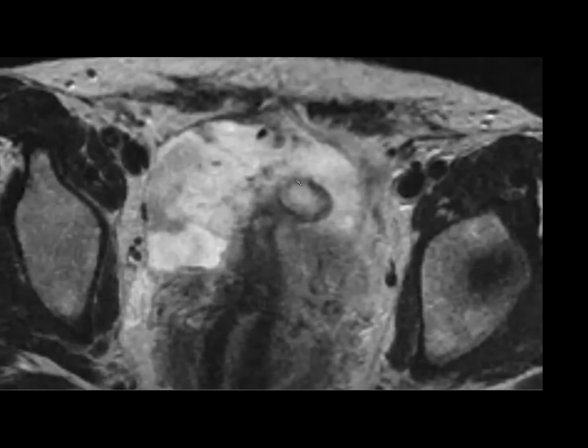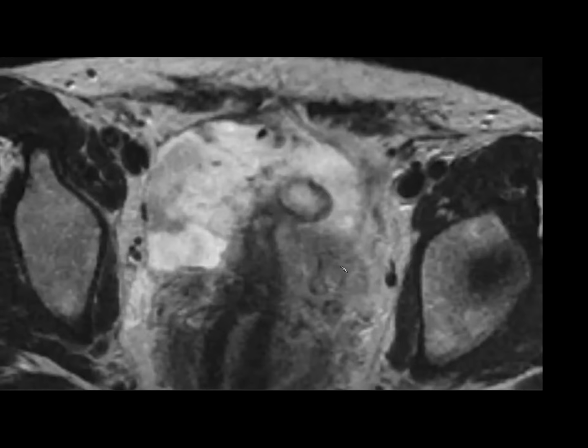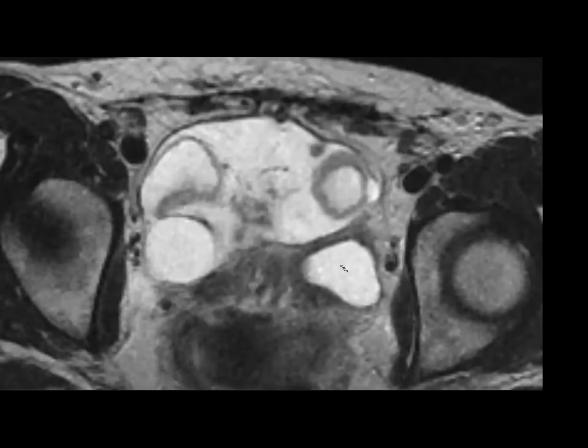And then do you guys know what this sign is called? Or what it means? Cookie just showed this, I think. Follicles. Hemorrhagic on the perifollicular, although you'd like it a little bit more T2 dark. Oh, it's Cookie. Every time I see this, I think of you. I feel like you've taught me this multiple times.